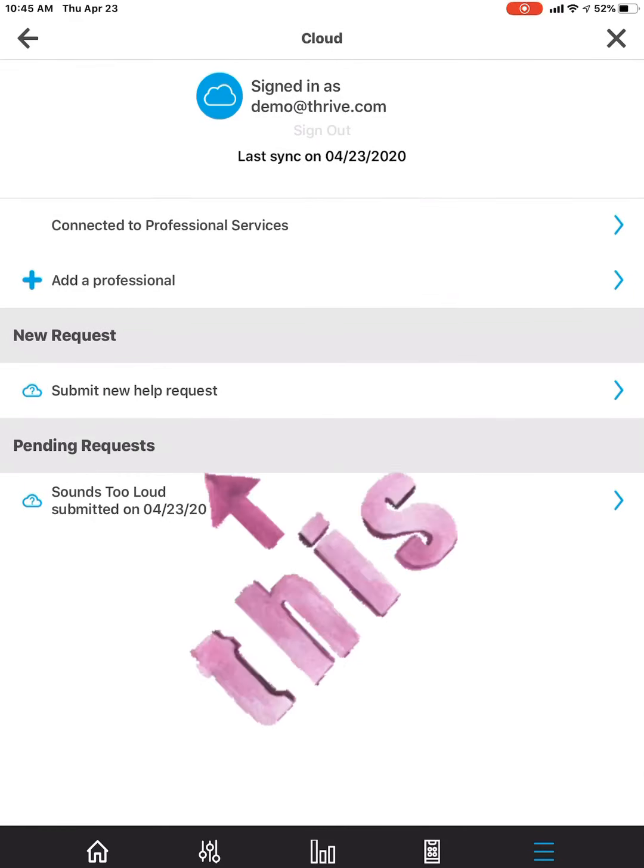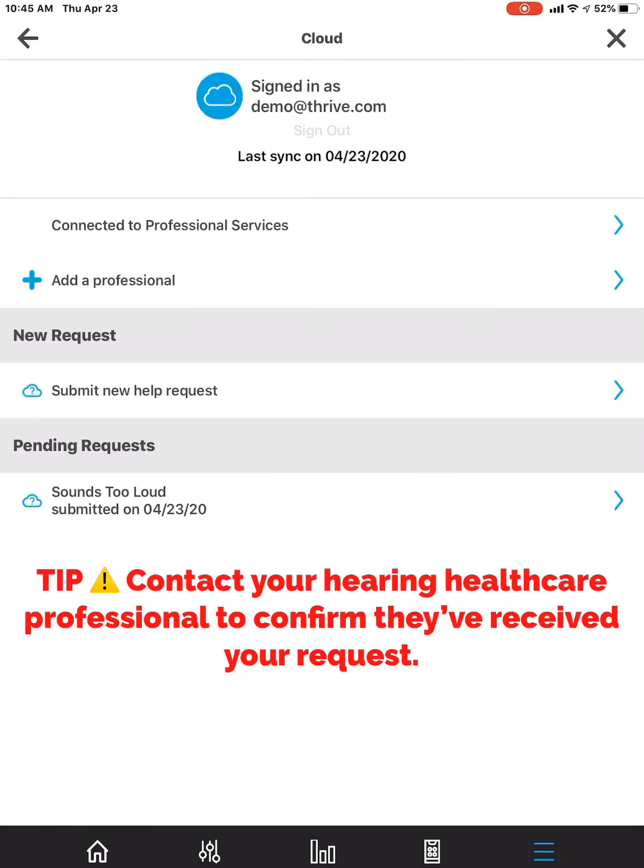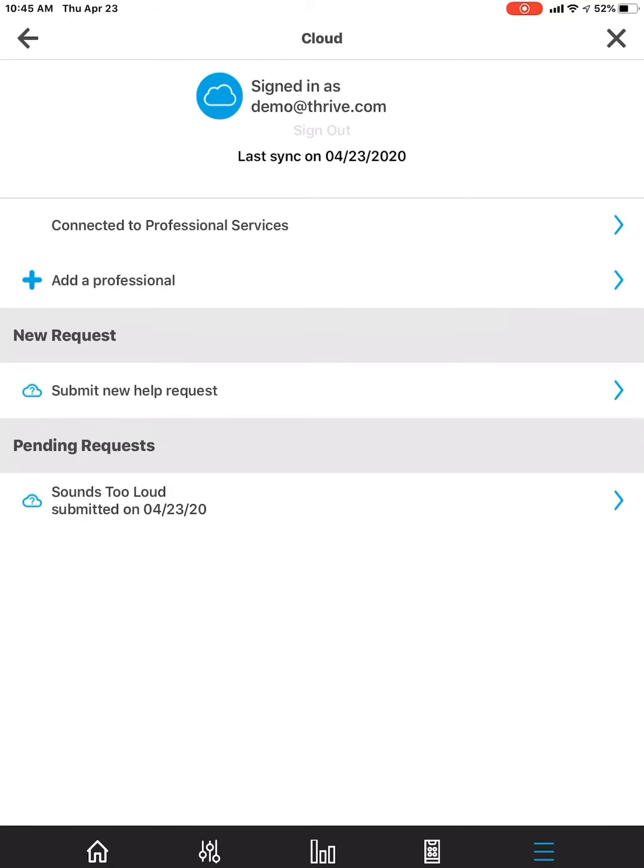And then you'll see it under the pending request. Things sound too loud, and that request was generated today. And with that, you want to always contact your hearing healthcare professional just to confirm that they've received the request. A lot of times in our office, we'll look at them in the evening. So if you've sent the request in the morning, give us a call. That way we know to have a heads up to look at it. And we'll contact you, let you know that we've received it.